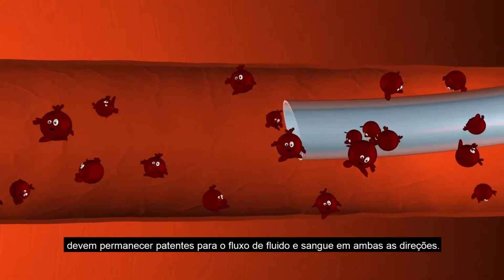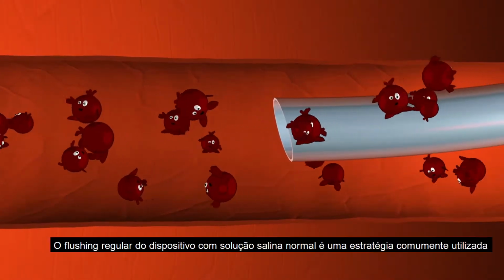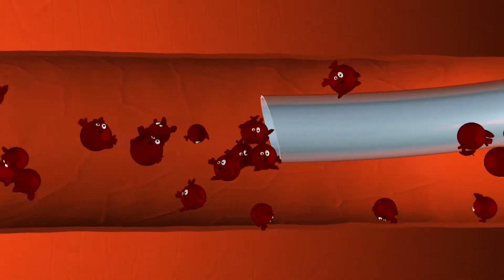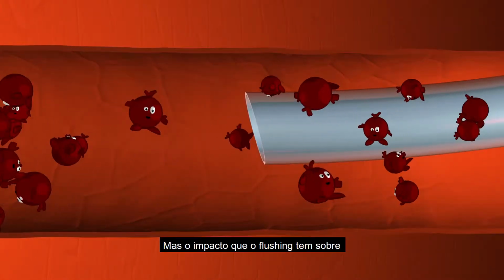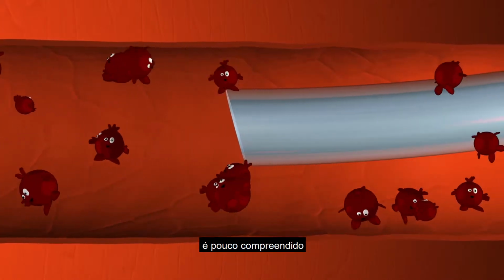remain patent to the flow of blood and fluid in both directions. Regular flushing of the device with normal saline is a commonly employed strategy to prevent occlusion and infection. But the impact flushing has on blood componentry and the vessel itself is poorly understood.